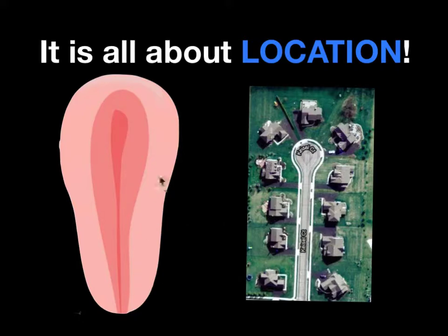If you look here, you've got your myometrium, your endometrium, and then your endometrial stripe. Think of this much like you would this cul-de-sac here. When you're building a home, you're not going to put the home in the middle of the road. Think of the endometrial stripe as being the road here, and think of the endometrial area here as being the yards.